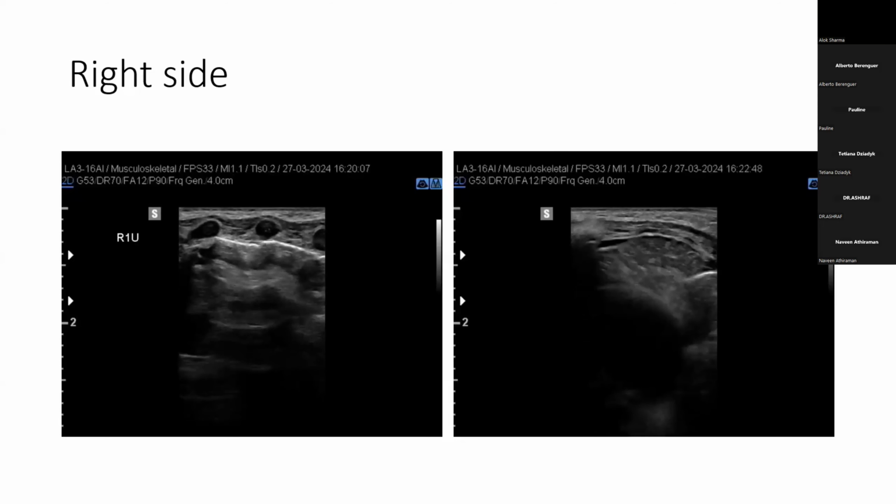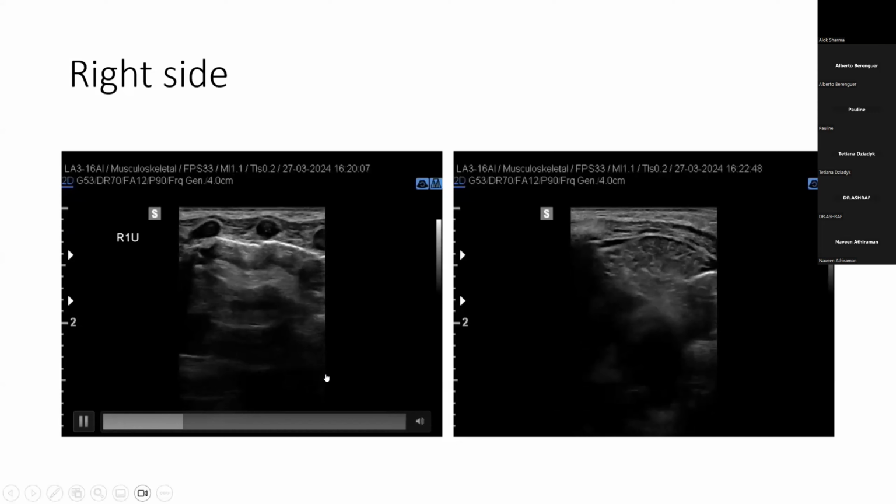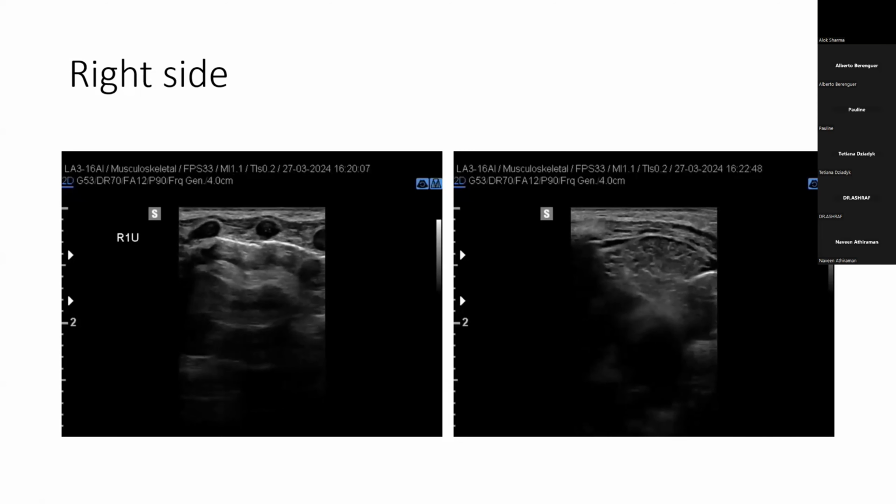Coming back to the right upper R1, were you feeling it's an A-dash profile? Yeah, I was thinking it. I didn't do an M mode on it. I think that's really, really important. The only reason I kind of say, and I agree, sliding is not typical. It's not easily visible at this particular point of time. You do have A lines, which would indicate well aerated lung.